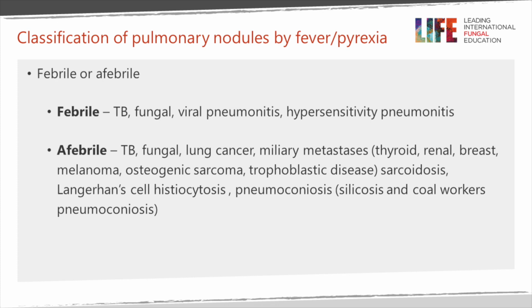Langerhans cell histiocytosis is uncommon and thought to be largely a reaction to cigarette smoke. Certainly the patients I've seen are usually at a later stage, but occasionally you'll see them presenting with tiny nodules through the lung. Silicosis is an important diagnosis, so a good occupational history is vital, looking for tunnellers, coal workers and so forth.